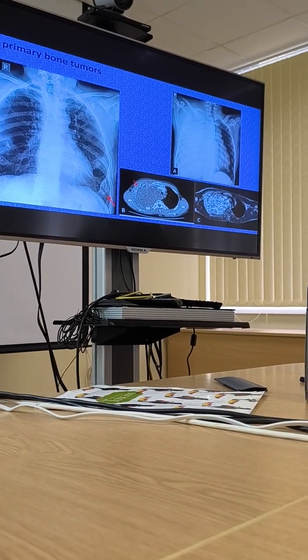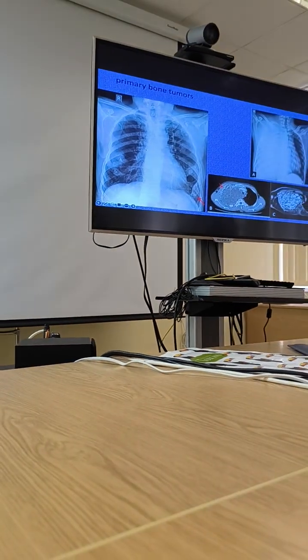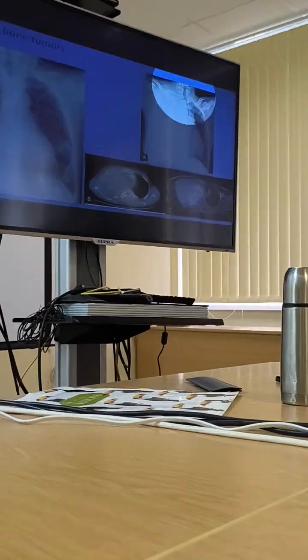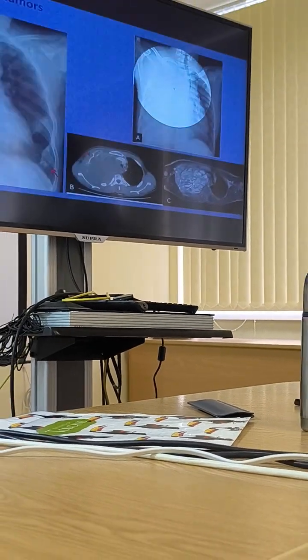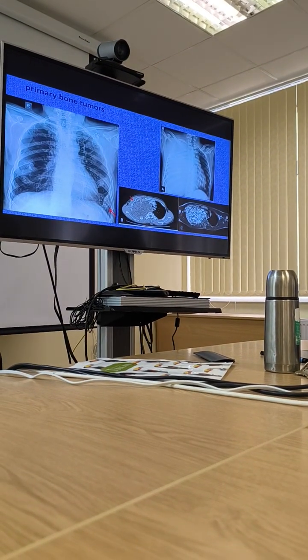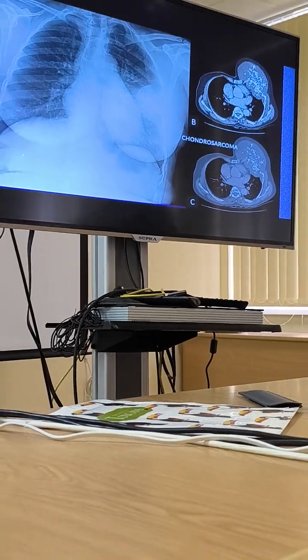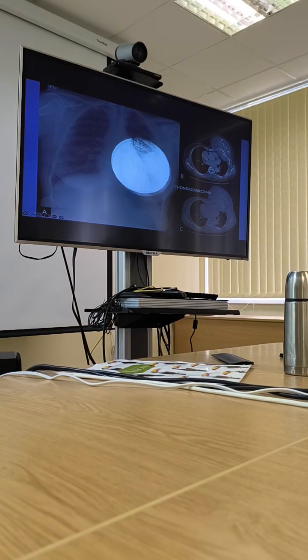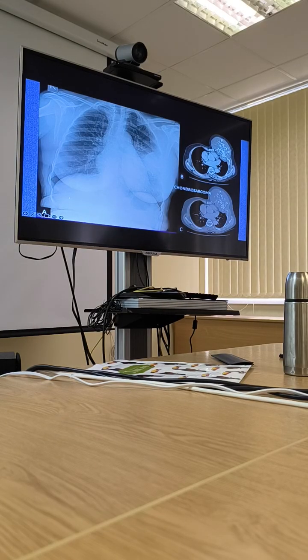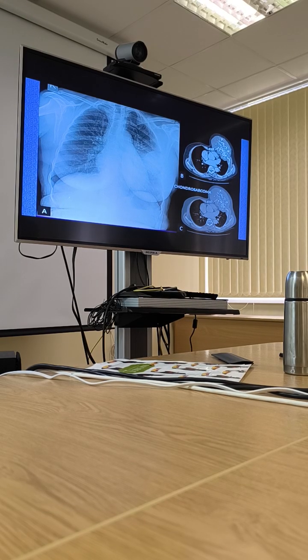And we can also see that they can be benign, like in this situation, and they can be malignant, like in this situation. See, this is a tumor, and this is a big soft tissue component which is growing into the lung. This is osteosarcoma, and this is chondrosarcoma. And again, this is a big tumor. We see it like a tumor. There's a special calcification pattern. Pay attention to this. So this is what we can see in the chest wall.